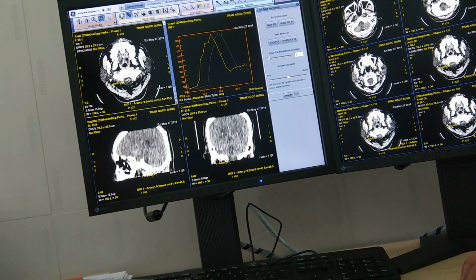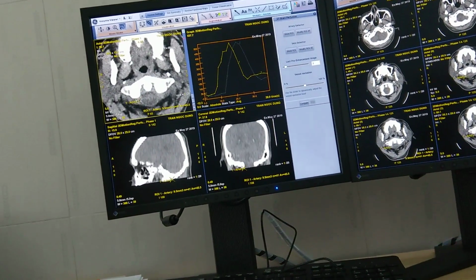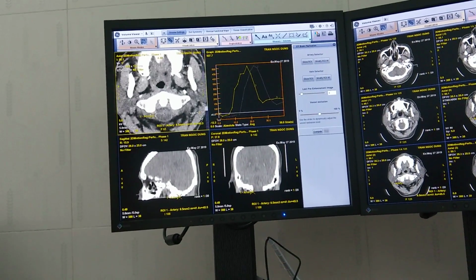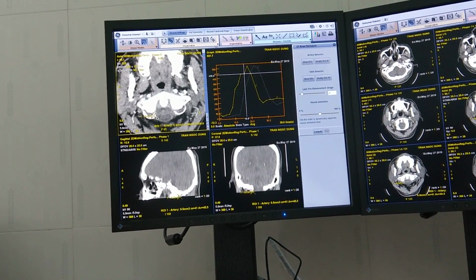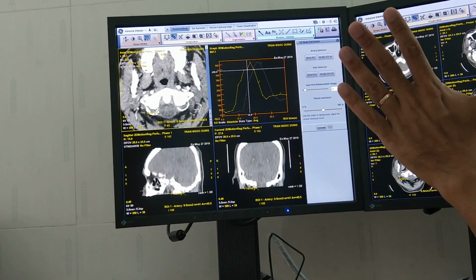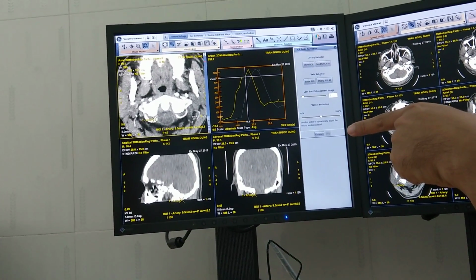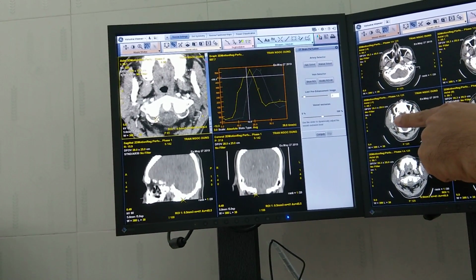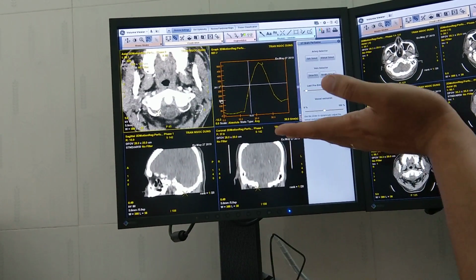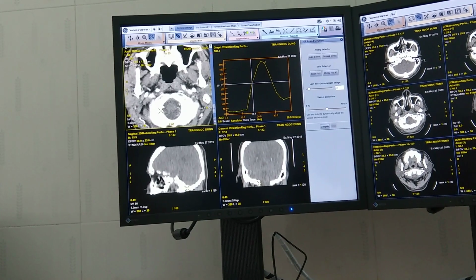It shows. So you choose here. This is the artery you choose. So you can actually see whether it is true or not. So you can see it is actually at the carotid artery. Okay. Let's say you don't like it, you think it is not correct. You can modify and delete. Just press delete, and then you choose yourself. Let's say I want anterior cerebral. Okay.